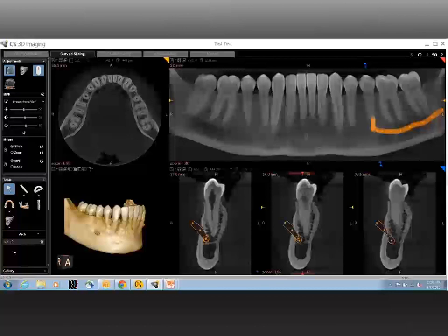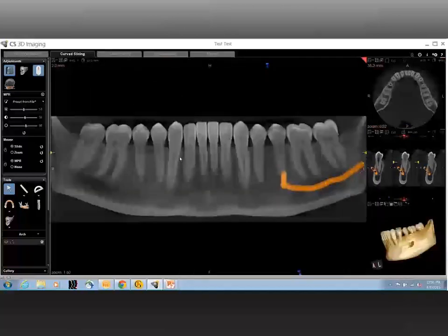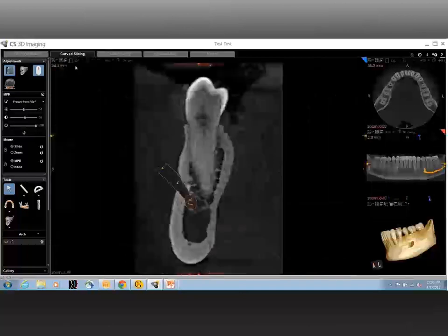Well, the answer to that question is a little more than just one sentence. So when you visualize anatomy and when you look at a two-dimensional radiograph, let's not forget that a two-dimensional radiograph is nothing but a two-dimensional representation of three-dimensional anatomy, which means that one of the dimensions is missing. Now, that dimension is the depth. If you directly compare a panoramic radiograph to a three-dimensional scan, that relates to buccal-lingual anatomy, which is essentially the depth.